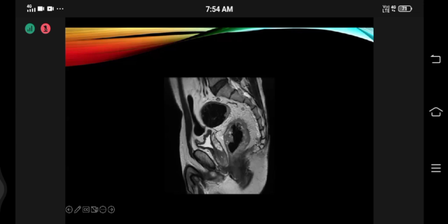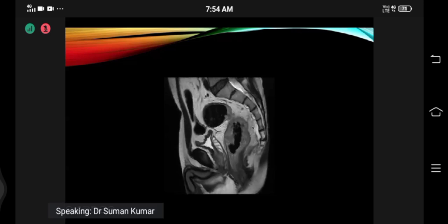So this black line is what you have to trace. So instead of remembering presacral fascia and all these things, you just have to write the black line which is seen posteriorly, that is the mesorectal fascia, and if it is involved, then you have to go beyond it. So if there is involvement of the posterior mesorectal fascia, the extent of the surgical plane would go beyond this one. So always you want to see that the surgical plane goes beyond the tumor.